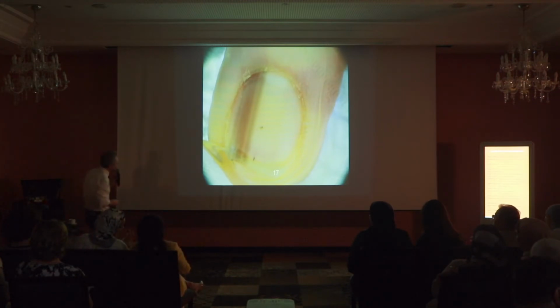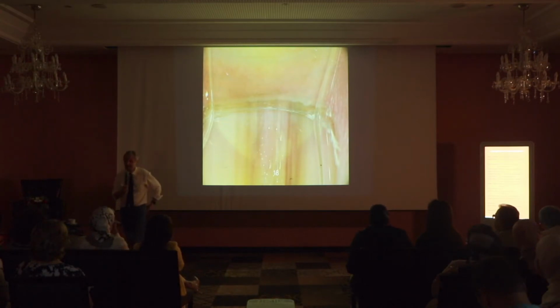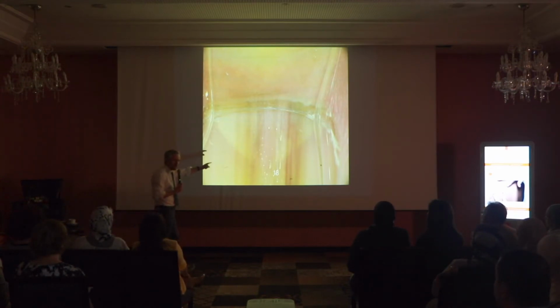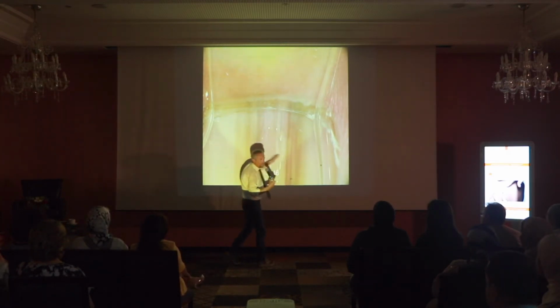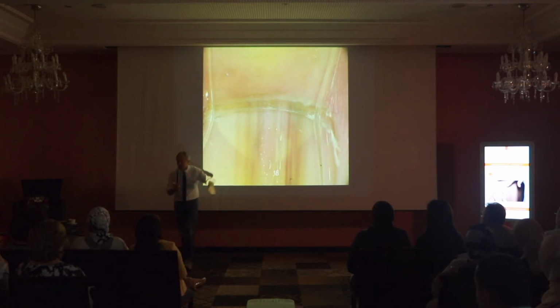So we can say after follow-up that the lesion is a nevus. Okay? It's stable. While number 18, melanoma, exactly. Why? For 3 reasons. First, 45-year-old. Second, look how large is the lesion, more than half of the nail plate. And look at the irregularity. Yeah?